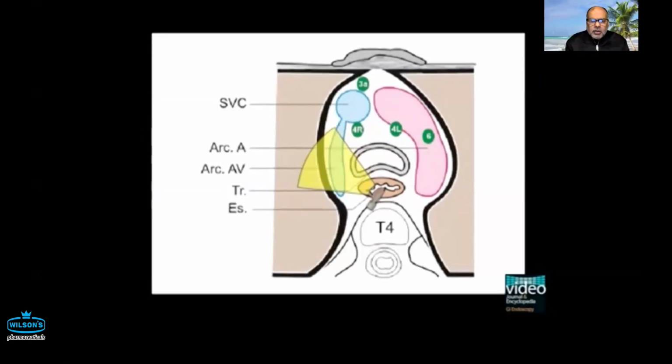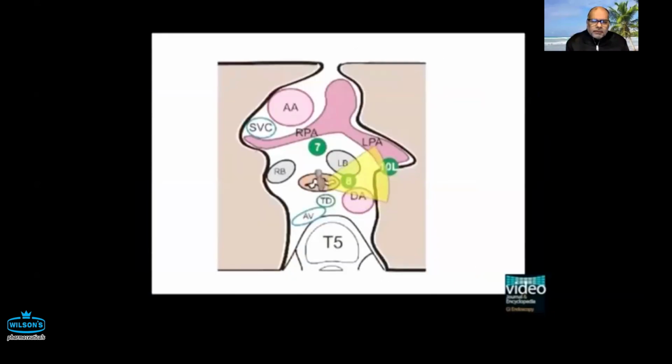And as you can see, if you rotate it clockwise, the area below the arch consists of the aorto-pulmonary window and the subcarinal space. Clockwise rotation shows the course of the right pulmonary artery as it goes into the right lung and divides into two branches. The main pulmonary artery is rarely visible because of its depth and its position in front of the trachea and main stem bronchi.